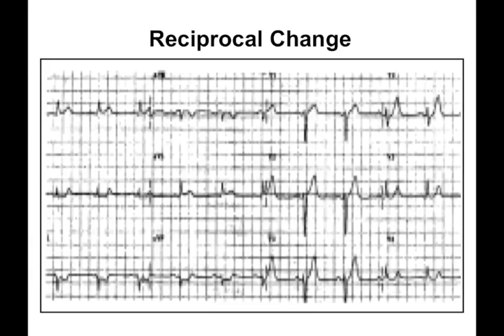Here's a 12-lead ECG that doesn't reproduce well, but basically shows some very subtle ST elevation in leads 1 and AVL that could be due to an early lateral STEMI. The ST segment depression in leads 2, 3, and AVF, which we have termed reciprocal change, is a very strong indicator that this ST elevation is in fact a STEMI, which it is.